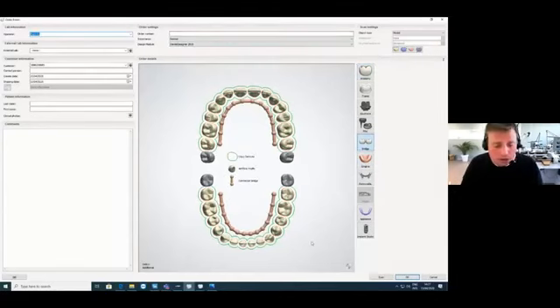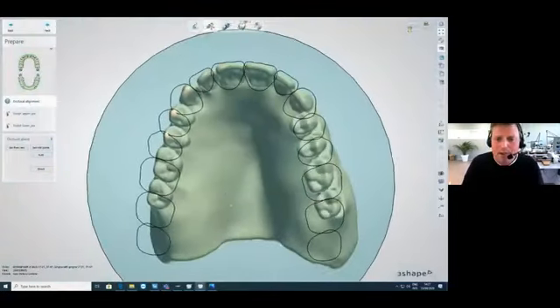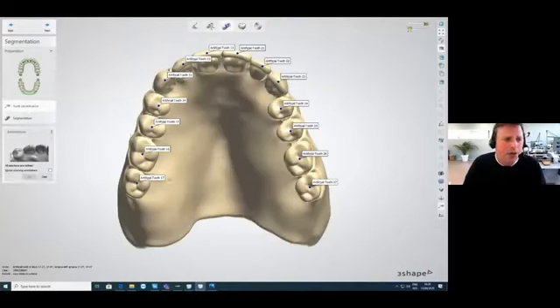And normally you can go directly into scan. There's a whole scanning protocol in 3Shape that leads you through the scanning process to make a copy denture, and then you go into the design. So I already opened some design. So normally when you hit the design button, you will start here, occlusal alignment. You make the occlusal alignment to the occlusal plane. And after that, you can sculpt it. So if you want to add some material or remove something on your scan, you can do it here. And then we go next, and you see the teeth and the identification.